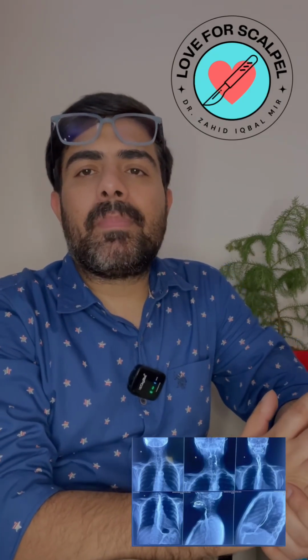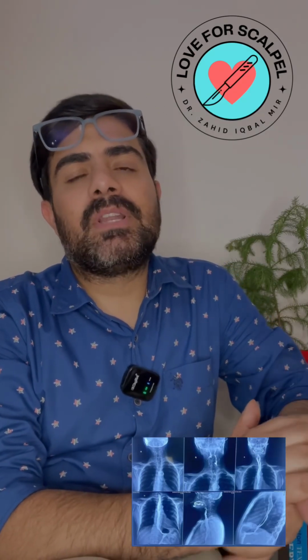Summarizing the findings, we have narrowing of the esophageal lumen with shouldering and tapering of the barium column. It can be called an apple core appearance. It is suggestive of an obstructive lesion. There is delayed emptying and proximal esophageal dilation also. The lesion is located most likely in the mid to lower esophagus.